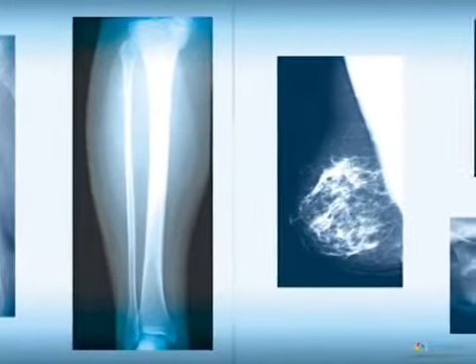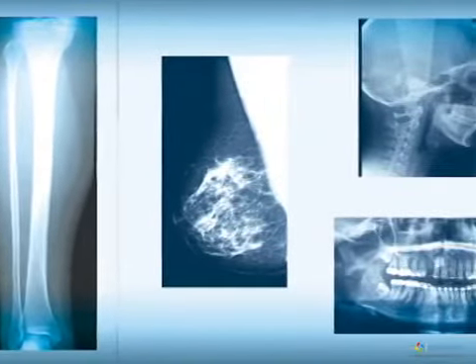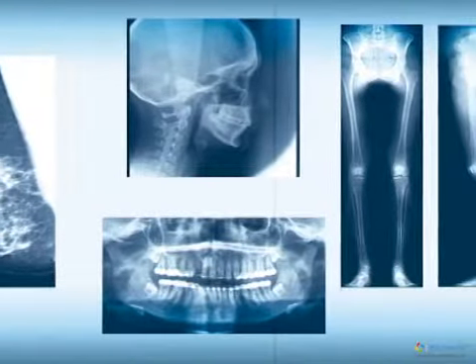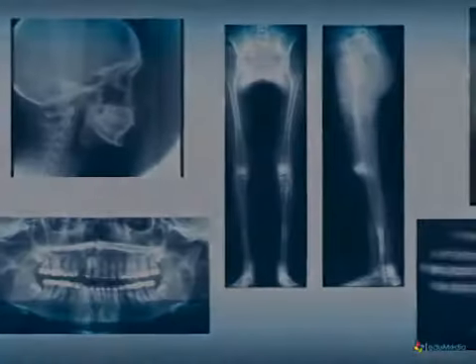Radiography rests on the principle of differential absorption of X-rays by tissues. The results obtained are photographs, in shades of gray that the physician will be able to interpret.